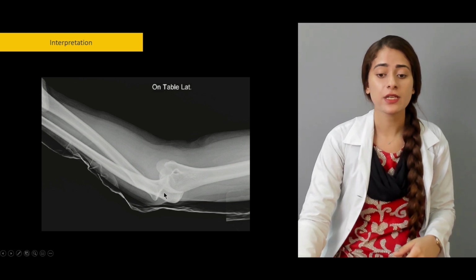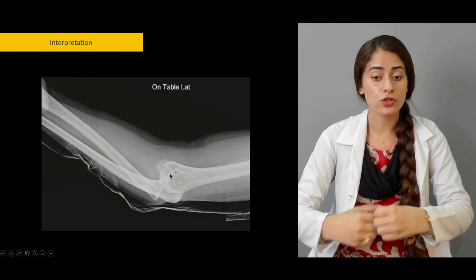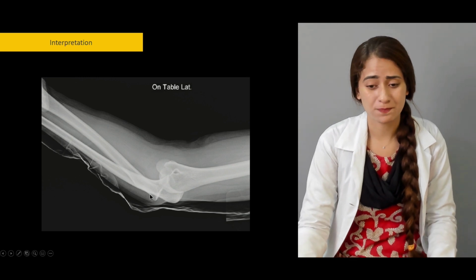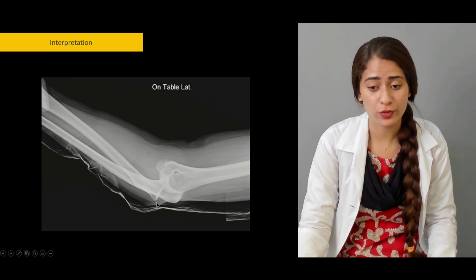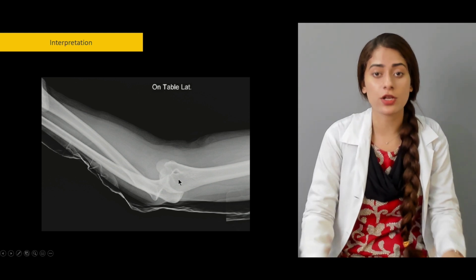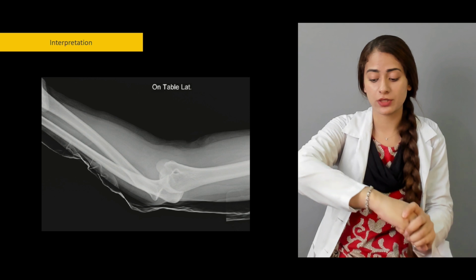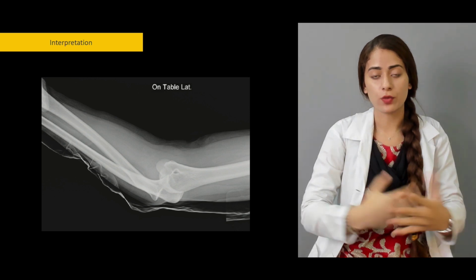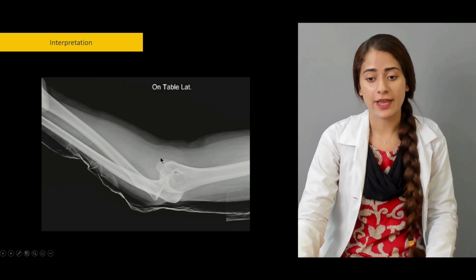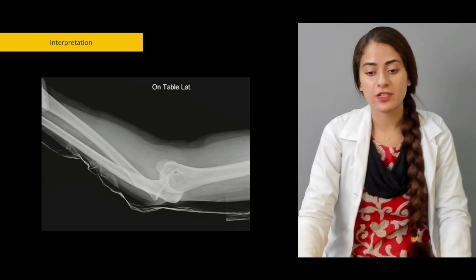If you think of this biomechanically, it is not possible for this individual to extend their arm, obviously, because these two bones will hit the humerus here, so extension is impossible, and this person cannot be asked to place their arm in orientations for a normal X-ray view.